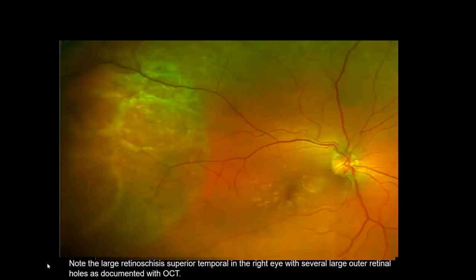Okay, here's the first one. Here's an ultra-wide field image, and the first thing we actually could look at is the optic nerve, which is over here, and some drusen of the macula. But in this right eye temporally, we're seeing a very, very large lesion, as you can see, and within that very large lesion there are smaller lesions. So this is sort of part of an ultra-wide field image in color, and the question is, now we want to use perhaps OCT to make a differential diagnosis of actually what's going on here.